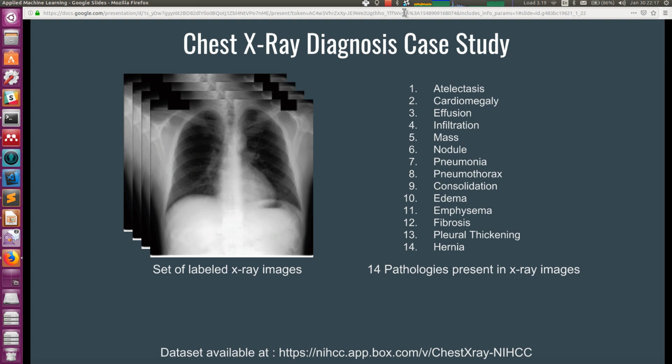The work that's been done here is a re-implementation of the model that was described in the paper, and I'm going to show you how to use some of the tooling that we've built in the Ready Solutions organization to build this pipeline locally on your laptop, and that should allow you to poke and prod with all the tools and utilities that are available and that we've used to build this particular example. I'll start with a little overview.